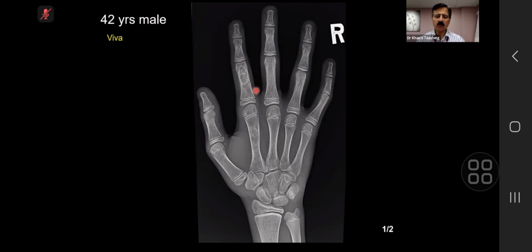But simple bone cyst, aneurysmal bone cyst, whatever, chondroblastoma, not in this particular case, but at times it can happen when it goes to the epiphyses. Langerhans cell histiocytosis, considering the age, so many things can be considered. But the key finding here was that chondroid matrix. So this is an enchondroma with chondroid matrix, which is punctate calcification.